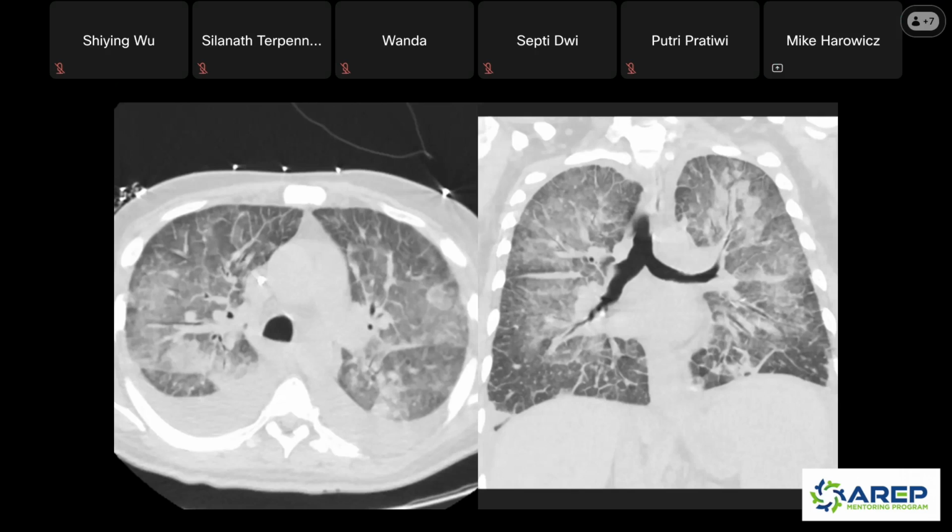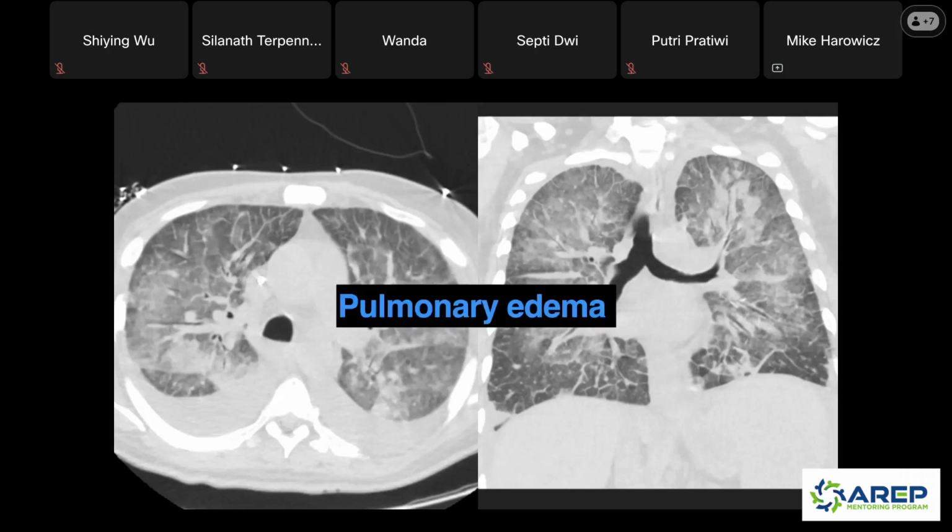So this is actually a great look for pulmonary edema, right? This patient has very classic findings of pulmonary edema, but the situation is pretty peculiar. They are getting these transfusions pretty regularly. People who get transfusions, a couple of different things could happen. If you get a lot of them, you could potentially get volume overloaded, because it's not like they just put platelets in with those transfusions, there's volume that goes in with that as well. And this person, I think, needed them pretty regularly, at least once a week, if not a couple of times a week.